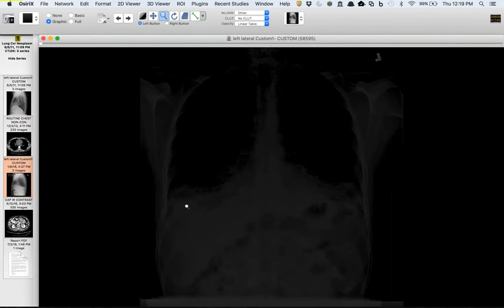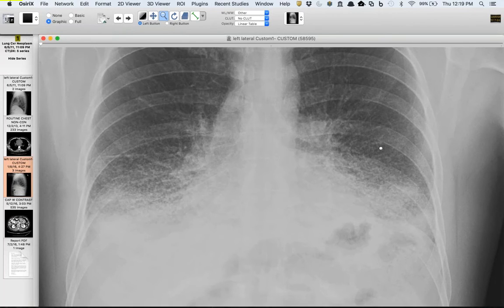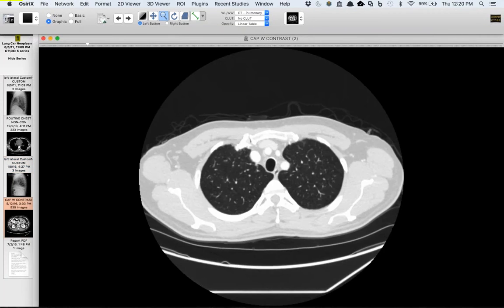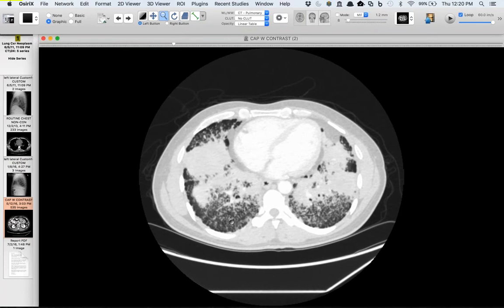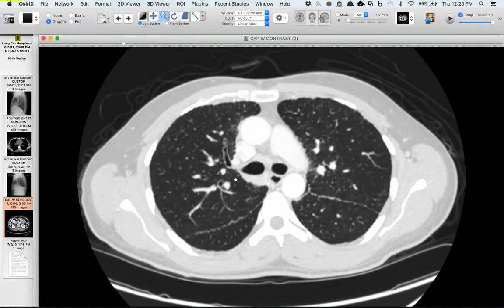And the reason I saw a follow-up on him a month ago, and I'll show you the intervening radiograph too, because it's really quite a confusing pattern. And I know that my colleague Brett hates when residents just say everything is reticulonodular, because in most cases you can tease out what's reticular and what's nodular. I would argue in this case there's nodular and maybe a combination of both. It looks like there's a little reticulation in this case, but this CT that we saw last month, I mean, this is now to the point where it's just like confluent consolidation. So, it's simulating consolidation with just the confluent metastatic disease that this patient has.